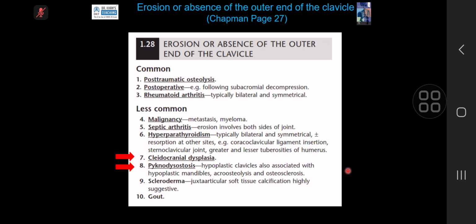The differential diagnosis will always be pycnodysostosis, as the candidate pointed out. But you should have a clear-cut idea about the differentiation between the two. In cleidocranial dysplasia, midline central ossification is lacking. The clavicle is one finding, but another finding in the midline is the symphysis pubis. And in the skull, Wormian bones and delayed ossification can happen in both of these conditions.